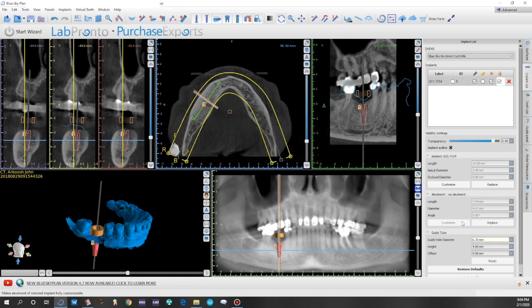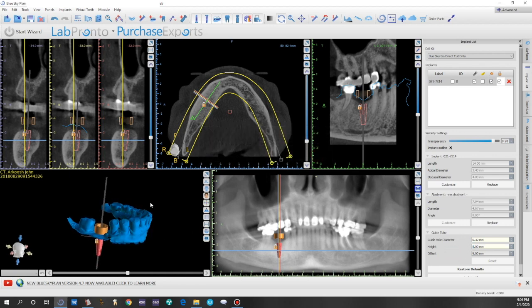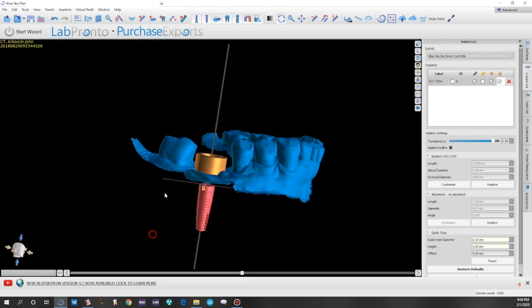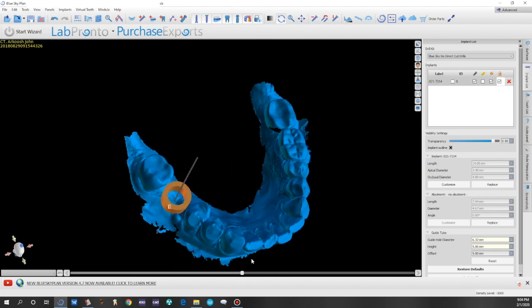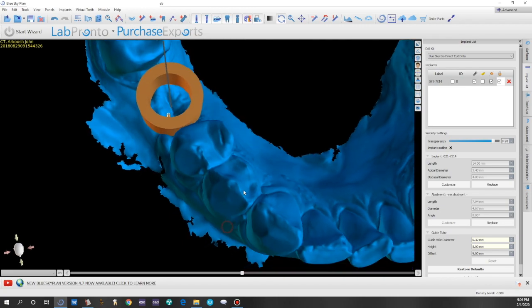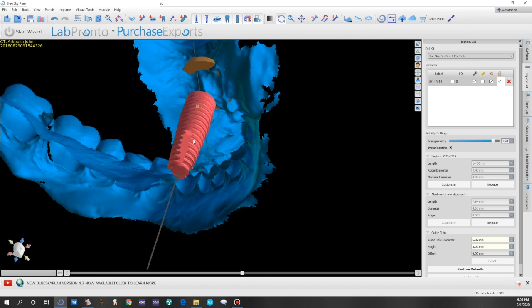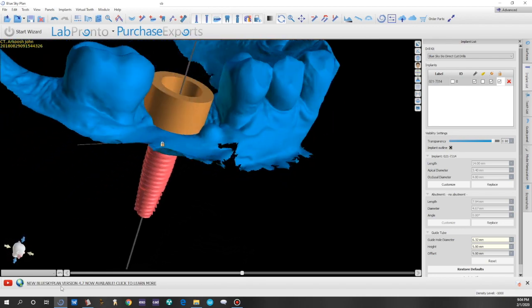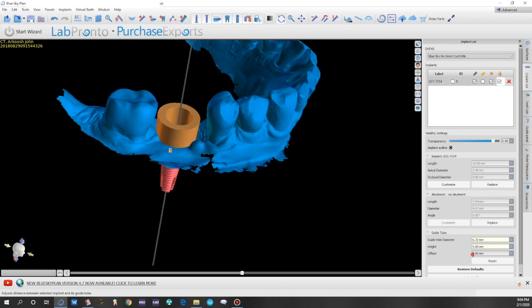Using the Formlabs printer, we add 0.02 to it to ensure that it fits nicely. The height of those guide sleeves is 5 millimeters. And now we have the position identified and planned for the guide sleeve within the guide. And we're evaluating to see how well that guide will be able to seat based on the tissue that's there. And it's perforating through the tissue, so we would likely need to raise it off the tissue. We do that with the offset.